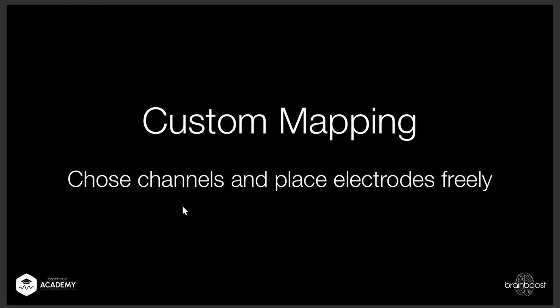So what does that mean? You choose channels and place electrodes freely, wherever you like. What does that mean? Well, in a training, if you do a ZZ SMR training, you're used to pressing the blue icon in our Brain Assistant and just saying dynamic mapping, continue.